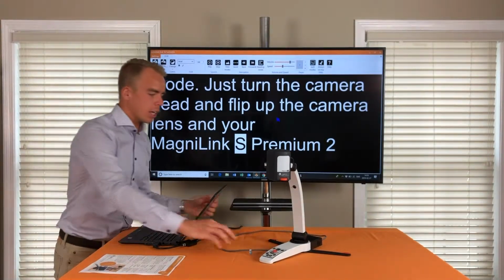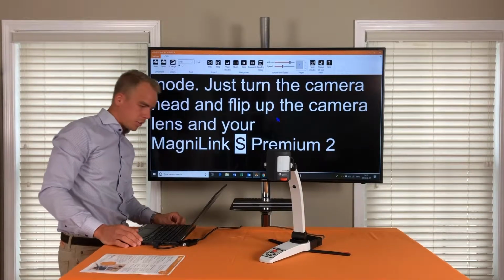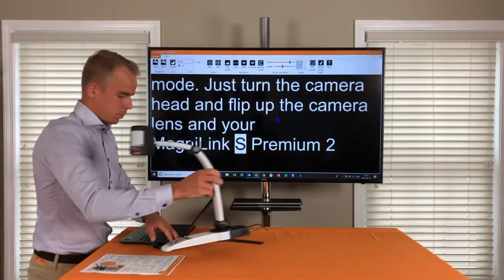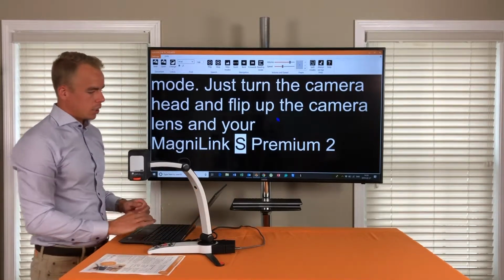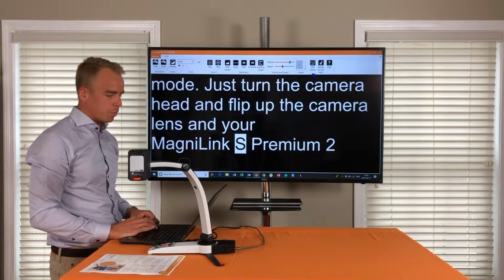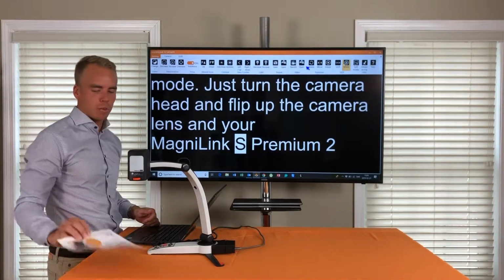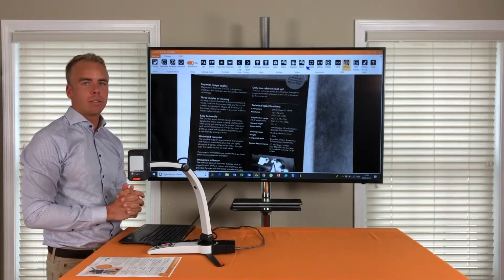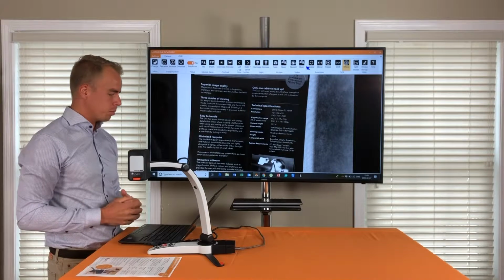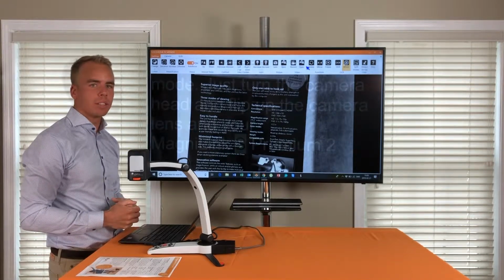Another thing that I will plug back the camera. Another thing that I also can do is that I can append text. So I can save a lot of pages into my software and have them read all out loud to me after each other, meaning that I can capture either 15 pages or so and have them all read.